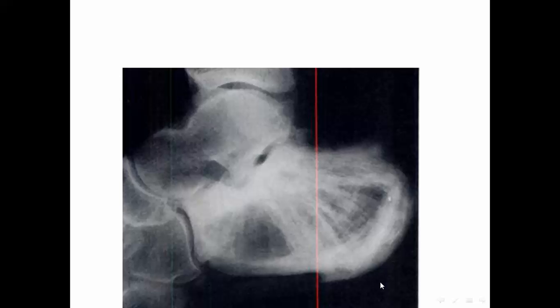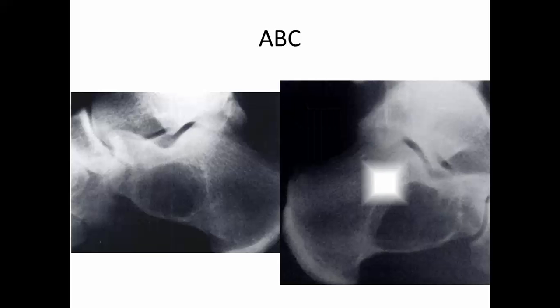Now here there is something different, in which we get increased girth of bone. The diameters of the bone are increased, and there is marked increase in the bone cortical outline. This is of course Paget disease. Here is a simple cyst of the calcaneum, but if we consider this bulge and the eccentric location and the interlacing septa inside, we should put ABC as a possibility.